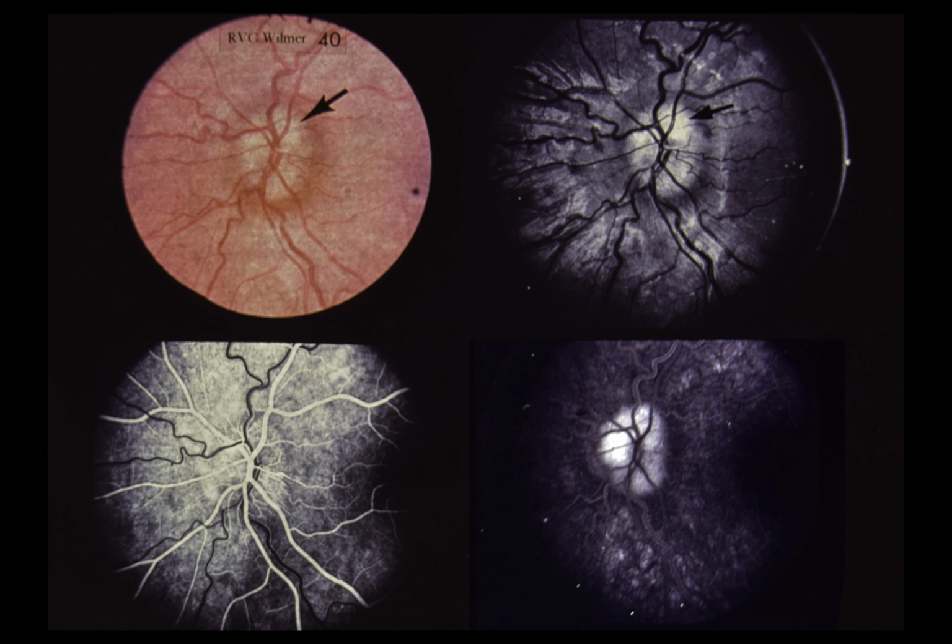This young boy complained of headaches and had bilateral optic disc elevation. He had no neurologic signs, no visual field defect, and no visual acuity loss. In addition, the peripapillary retinal nerve fiber layer was not blurred, the retinal vessels were not obscured as they emerged from the center of the disc, and the fluorescein angiogram showed no leakage from disc capillaries. The lack of clinical evidence of optic disc edema should suggest the diagnosis of optic disc drusen and prevent the clinician from proceeding with any further evaluation.